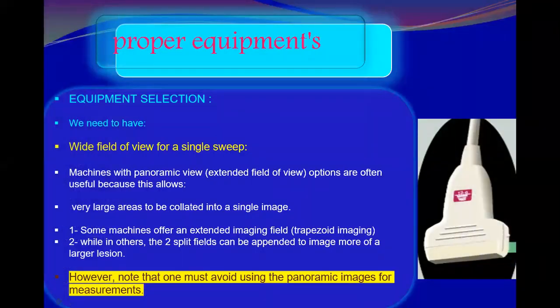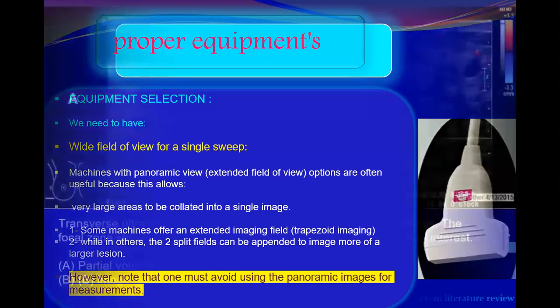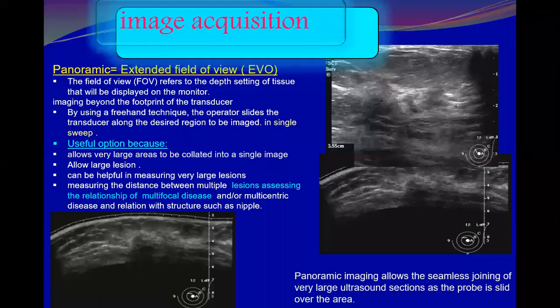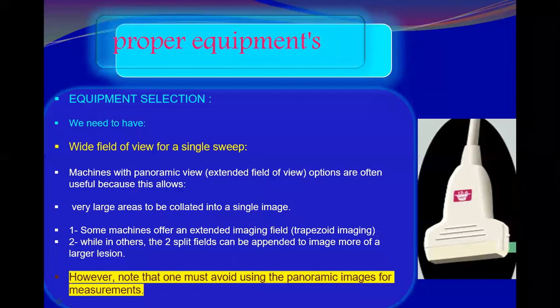Regarding equipment selection, we need to have a wide field of view for a single sweep. Okay. So what is a wide field of view? Do you know it? This is what we call a panoramic view. Okay, the panoramic view, the extended field of view.